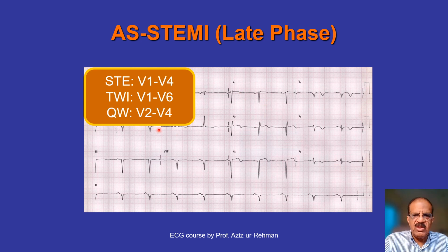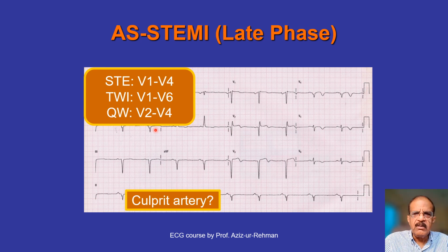So we have seen these changes. So I think the diagnosis of anteroseptal STEMI or anterior wall STEMI is very sure. Which artery? Again, left anterior descending artery.